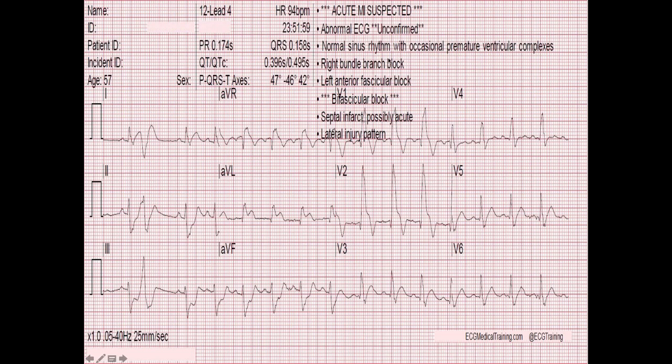Similarly here, and this is things running into things, so excuse that, but I have a normal sinus rhythm. I've got some PVCs here and there, but normal sinus rhythm. Lead 1 is up, AVF is down. I have a left axis deviation. Lead 2 is down, is negative. I have a pathologic left axis deviation. QRS complex is wide. If we go to the numbers, QRS is 0.158 seconds long. That's long. It's wide. I go to V1.